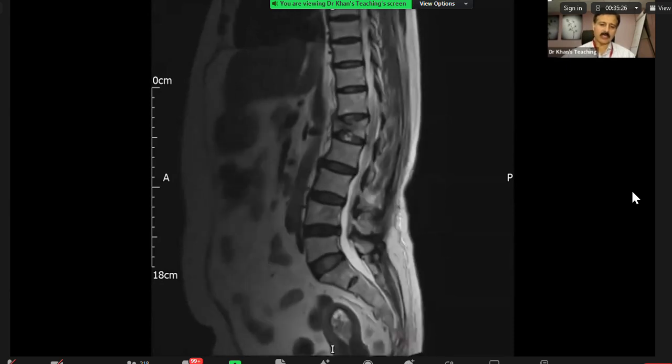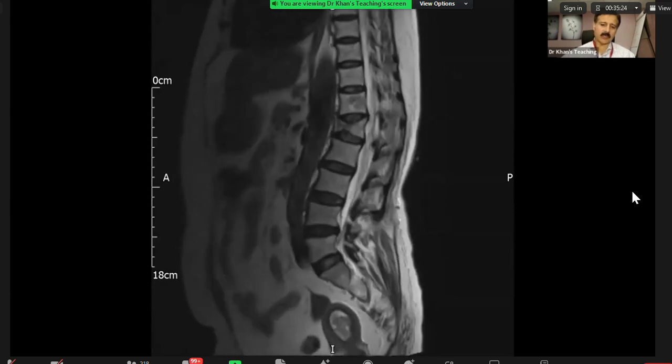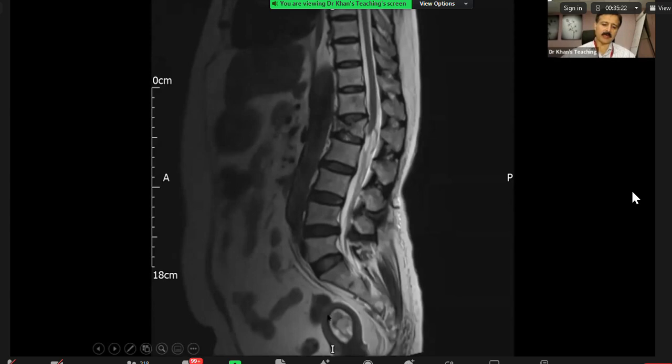You see, the teaching points here are, first of all, this was well picked up, the endometrial, this was an incidental finding. Any endometrium which is more than 4 millimeter in thickness in postmenopausal, call it. And MR is not the correct answer. The correct answer is I will refer to the gynecologist for hysteroscopy.